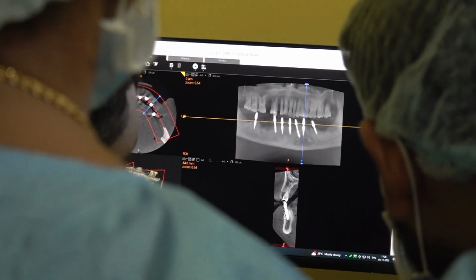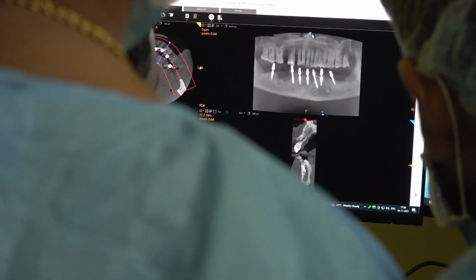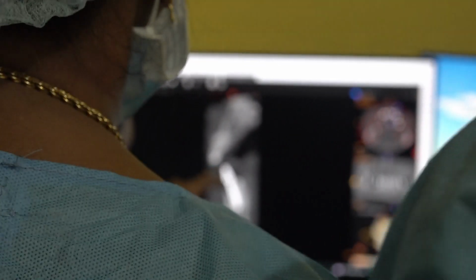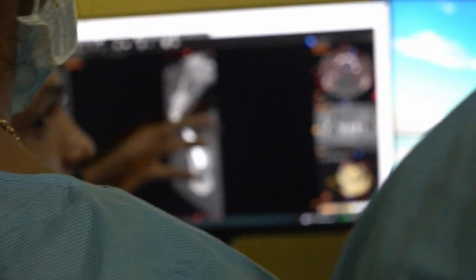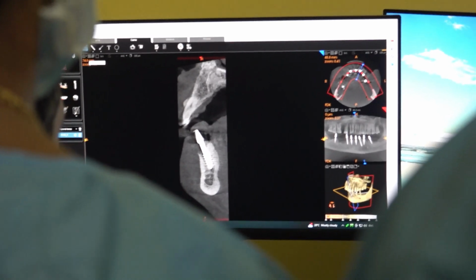Second premolar. Below, the radiolucency is there. This is the basal area. This is the basal implant. You can see lingually the bone is very good, but buccally. So if you place a compressive implant, this 4 to 5 mm will be exposed without any bone. So you need to do bone graft and all, but this simply solves the problem.